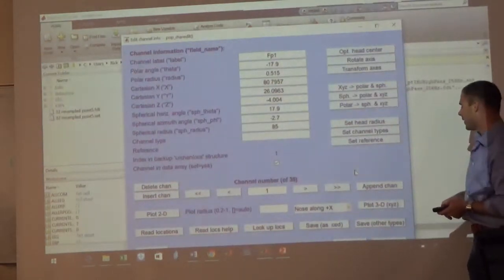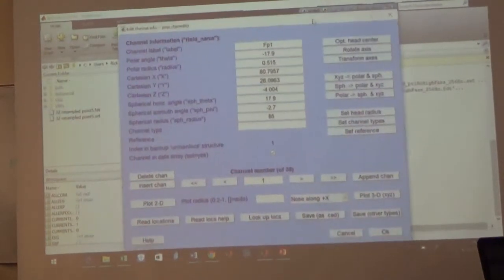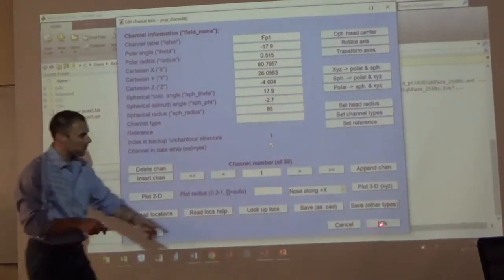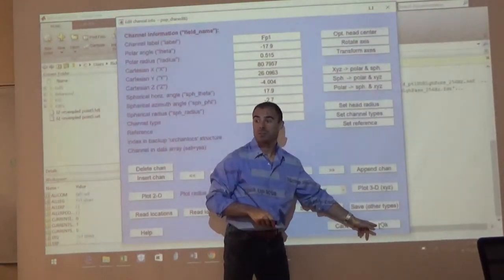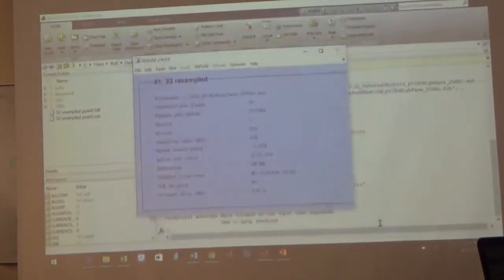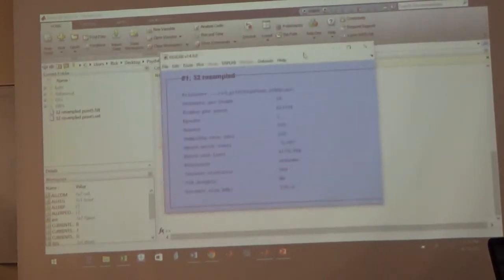All we're going to do is pull it up just a little bit. So drag that up so that you can see that now it says OK down here. That's all you have to hit. Super easy, right? Okay, cool. Just hit OK. Just hit OK. Okay. Can anybody not do that? Awesome. Easy, right? Okay, cool. One thing down.